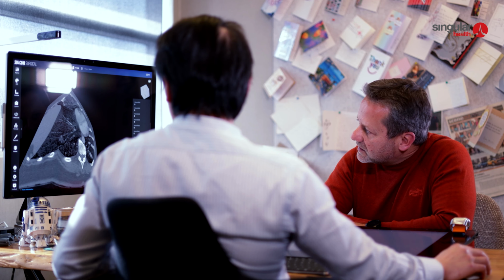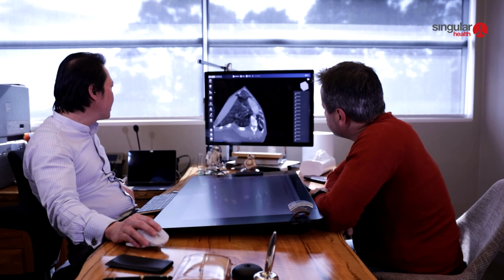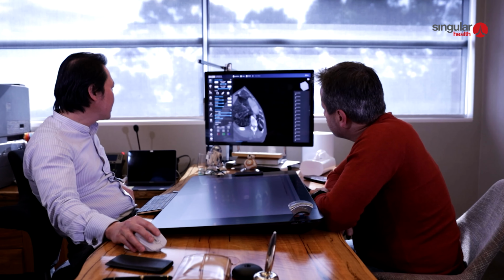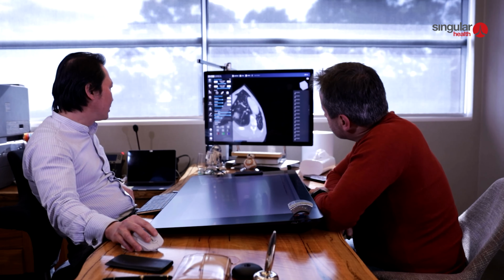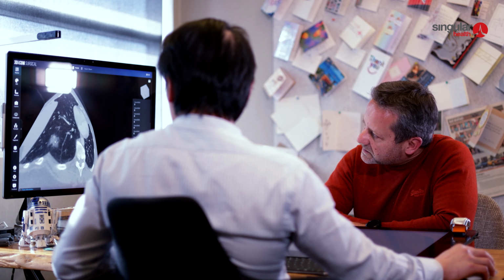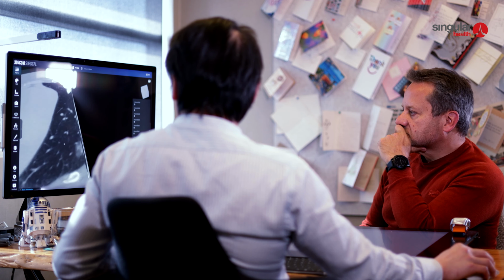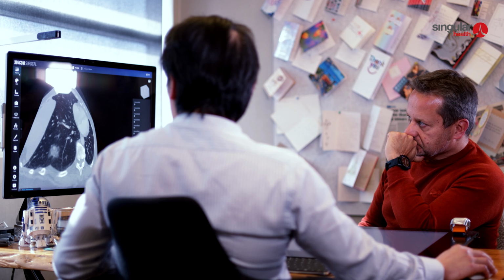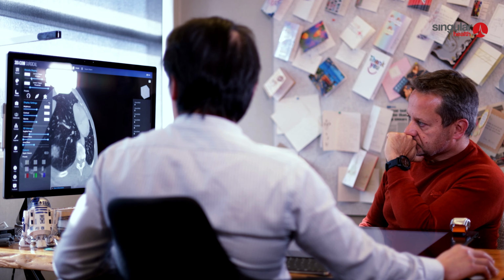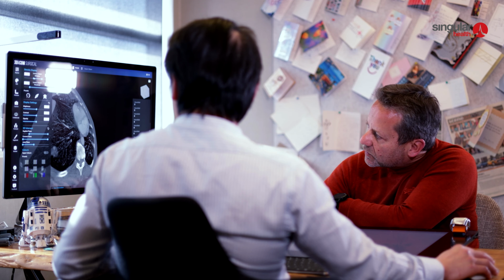Okay. So what am I looking at here, Dr. Smith? So if you have a look, normally this is what the lung looks like. I'll just make it a little bit brighter. So that's what you saw earlier on. Yeah, I do see that contrast, and you can see that whiteness there. Right. And you say that's a little bit different. It's no different to the other whiteness, but then I'm just going to change the image a little bit so you can see the blood vessels and actually the airway of the lung.